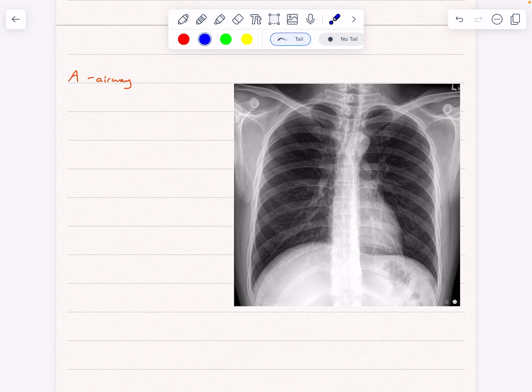If, for example, there's a lower lobe collapse in atelectasis, you'll see something called Sail sign. If it's an upper lobe collapse, you'll see a Golden S sign. You can Google images of what those look like. If the trachea deviates away from the side, so let's say this lung is the problem and the trachea goes that way, you'd be thinking something like a pleural effusion or pneumothorax, whether it's tension or not. So it's almost like there's stuff going on in this lung and the trachea is now being pushed away.